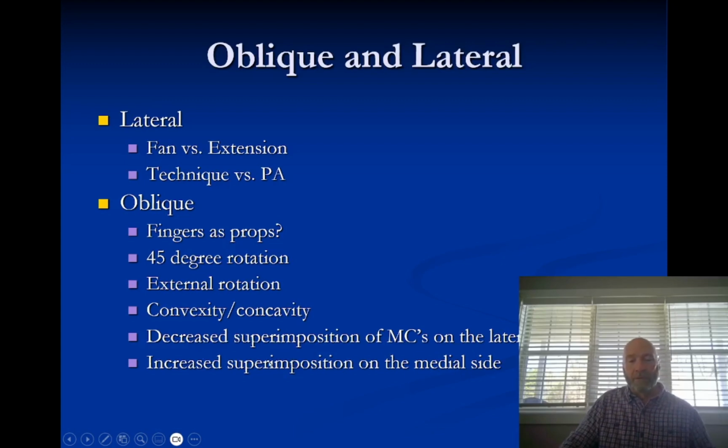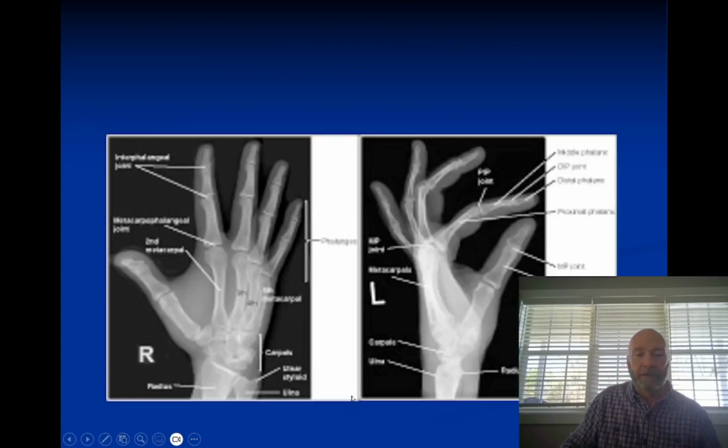So you're going to evaluate those too. So here's what we've got. All right, so these are not ideal because sometimes the pictures that are provided in the publisher PowerPoint, whenever I magnify them up into a PowerPoint itself and save them on my computer, they just don't save all that well. And so we've just kind of got a fuzzy mess here.